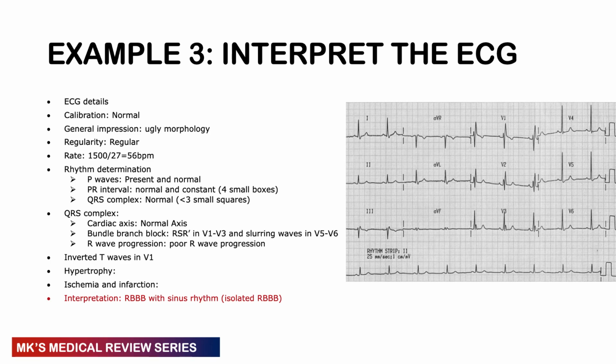So that's how you would interpret this ECG, and that's how you would actually work through these ECGs, and you should be able now to have an idea or be building up on your concepts and understanding the ECG.